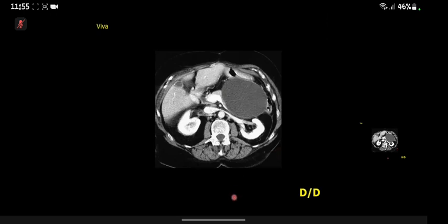So I'm presented with a CT scan, axial slices at the level of the pancreas and kidneys, which shows a large, well-defined cystic attenuation lesion within the body and tail region of the pancreas. It is thin-walled, and there is very, very mild enhancement, maybe anteriorly. The differential diagnosis would include pseudocyst, less likely an abscess, or a cystic pancreatic tumor.